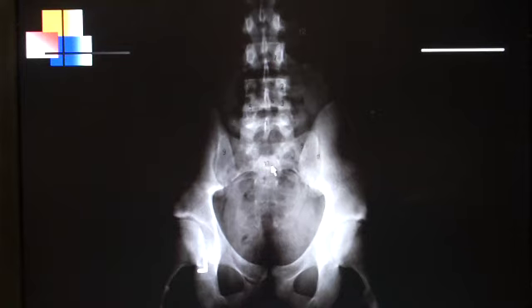Number 10 is the second sacral tubercle. Number 11 is the SI joint. You're not really looking through the SI joint because you have an overlapping of sacral ala with the posterior aspect of the ilium. So all of this is the sacral ala, and this is your joint space. But including myself, we point to this edge right here and expect you to label that SI joint, but really if you need to see the SI joint, you would take what is called a sacral oblique view.